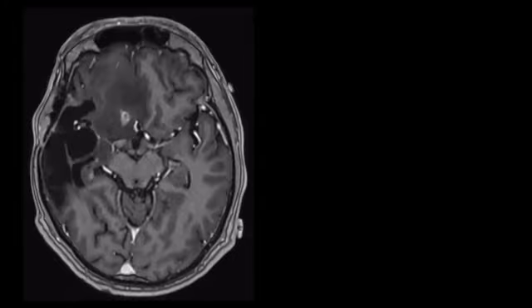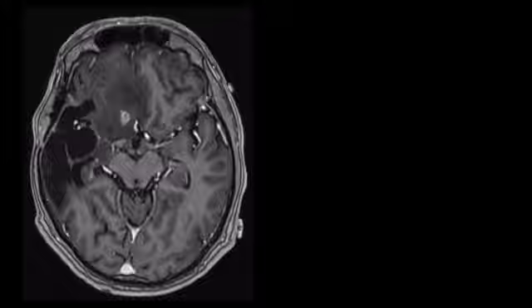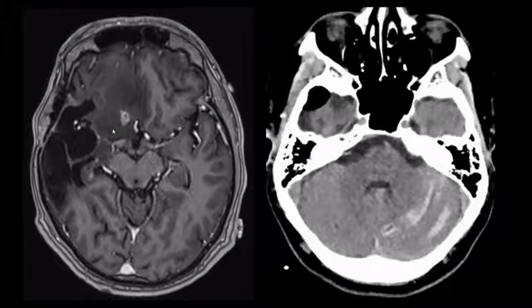This one is a true sign, and it's also one of those nice ones because it's a rare entity, but it has such a typical appearance that if you recognize the sign in the appropriate clinical context, you have a diagnosis. This is a patient who clearly has tissue loss, old tissue loss, in the right temporal lobe. This is the result of an old surgery. And we also see a recurrent tumor located in the frontal lobe. Patient underwent surgery for the recurrent tumor, and on the images after surgery, we see a striped hemorrhage.